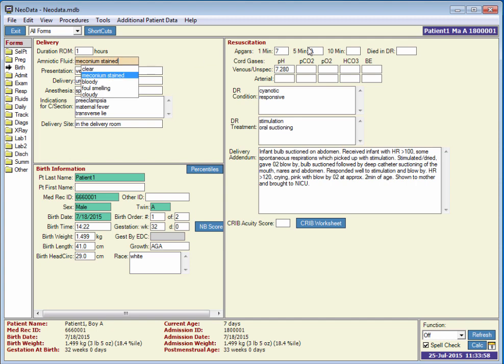You can also define ranges for number values so that you are warned if you enter a value out of range.